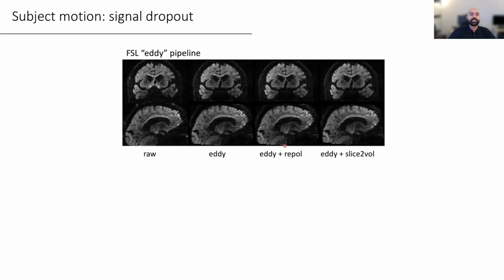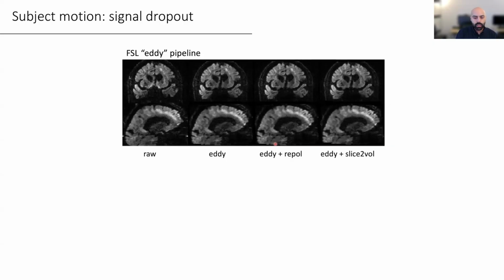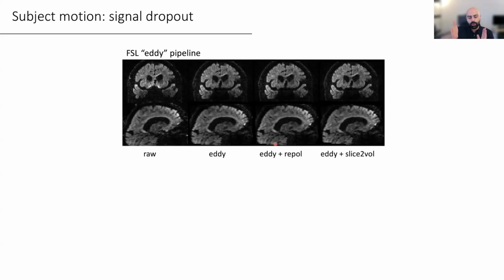But you'll notice that we still find ourselves with some of these lingering artifacts at the end, where we've maybe filled in some gaps, but there are others that still remain. And that's because ultimately, if the person started halfway through an acquisition volume itself, so every TR of the diffusion series takes a few seconds, could be 3 to 5 seconds.